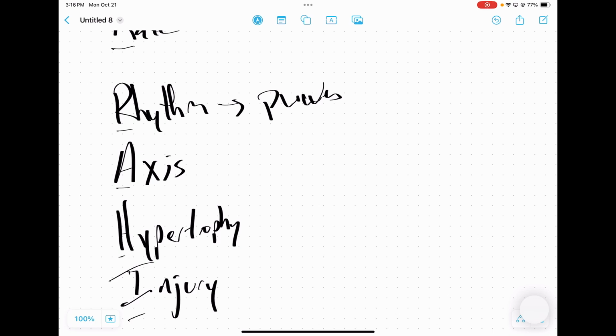What is the axis of this 12-lead EKG? Remember the thumbs up method. Left hand is lead 1. Right hand is AVF. Look at the QRS complexes, and we'll review all this in a minute when we go through the slide. Lead 1 is left thumb. AVF is your right thumb. We'll go through it in a minute.